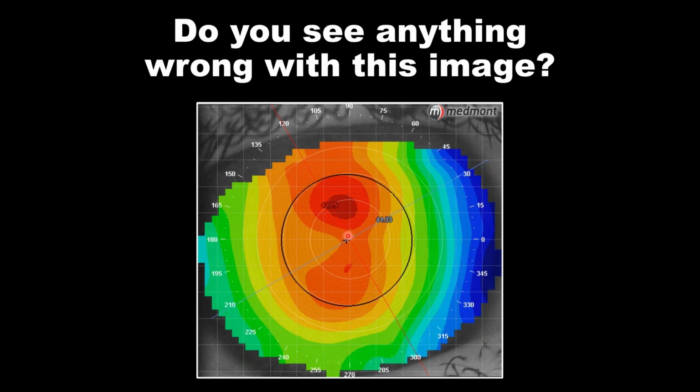spherocylinder refraction. But looking north, you notice that the lid and eyelashes are limiting some of the coverage of the superior topography. And this is a reminder for your orthokeratology, when you're wanting to construct a lens, a rigid contact lens, do a composite topography. Don't just do a single map. Then we would understand a little more of the data up here.